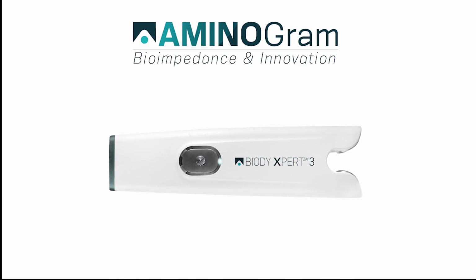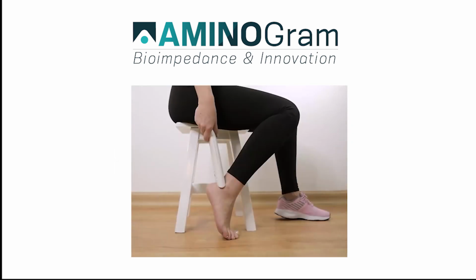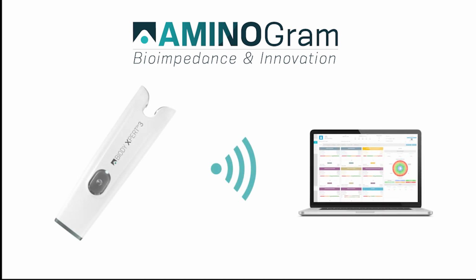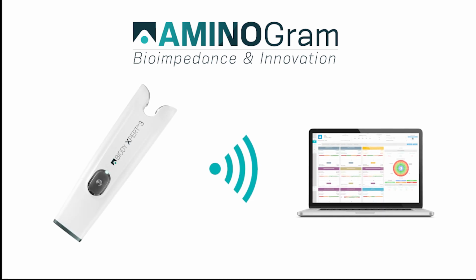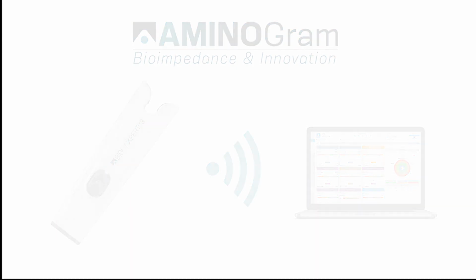The applications paired with BIODY impedance meters require internet access for analyzing the measurements. The operation is as follows. The patient performs the measurement, and then the impedance meter sends the data via Bluetooth to a terminal. Let's now move on to the installation of your device.